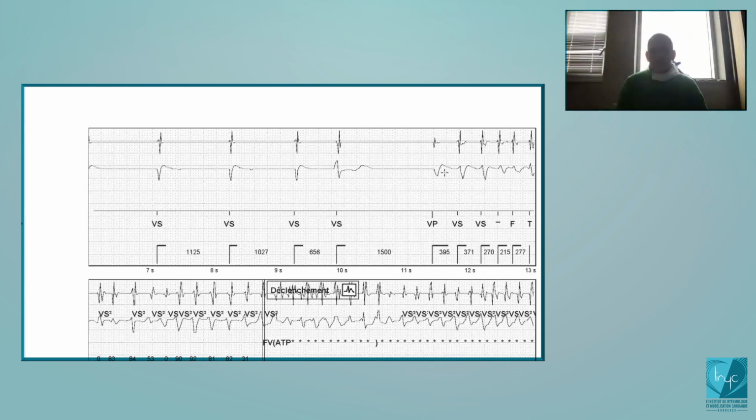Yes, the tip or the coil. Good. So you will base the discrimination now on this channel. That's different, that's what I have tried to explain. I think it has consistently improved the quality of the morphology analysis in the new platforms of Abbott.